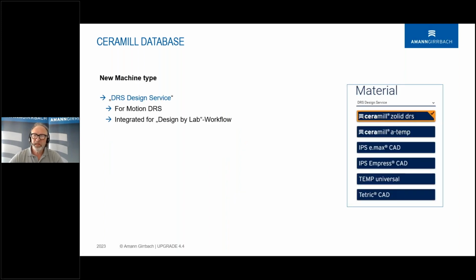If you click material, normally our milling machines appear here. And one of these buttons, which is not a milling machine, will now be called DRS Design Service. And Design Service is a workflow. The workflow looks like this.